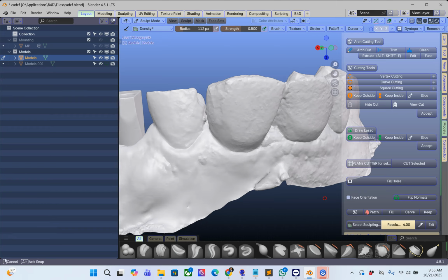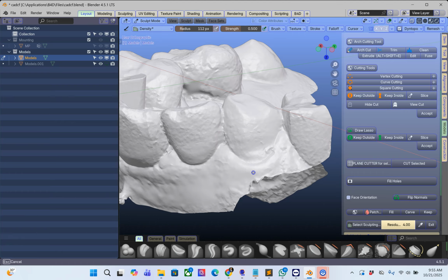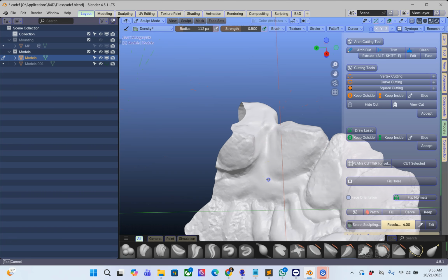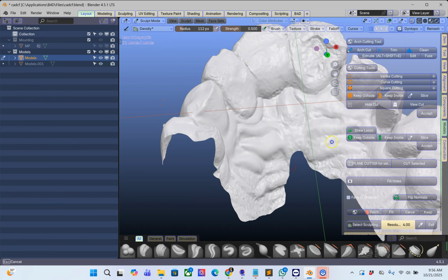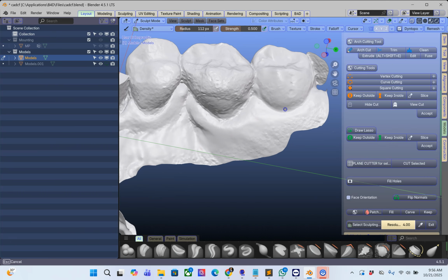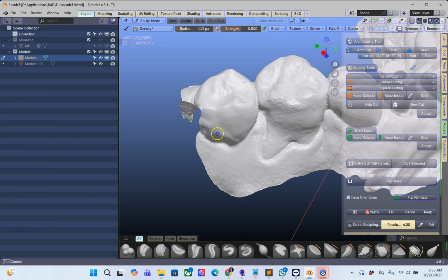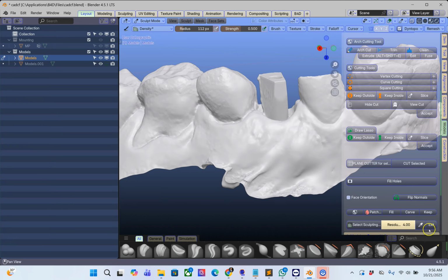When you look at this scan, we've got this irregular geometry over here, and even when we want to come up with the arch cutting tool over here and across it, we want to smooth it down, because otherwise it's not going to give us a nice model. I'm going to come up with the arch cutting tool here. Basically I'm preparing the surface to be cut. We don't always have to do it, but if the scan is rough like that, it makes perfect sense. It only takes 2 seconds to do.